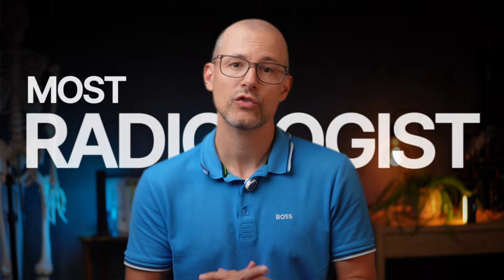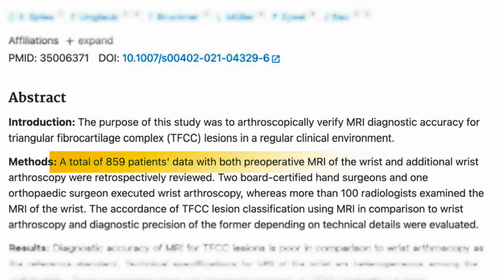Most radiologists struggle to report the TFCC on MRI scans, and they're often completely wrong. In one study of over 800 MRI reports by over 100 radiologists, the TFCC was incorrectly called normal 45% of the time, when in fact there was a pathology. These missed tears mean delayed treatment or surgery for the patient.